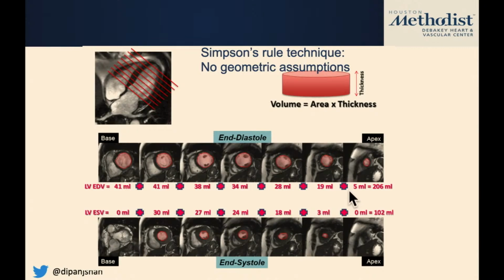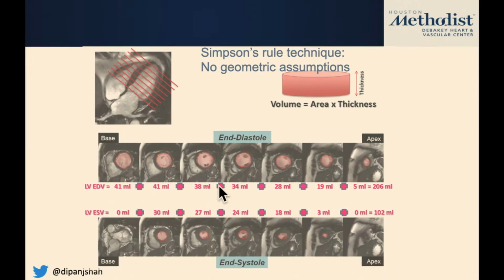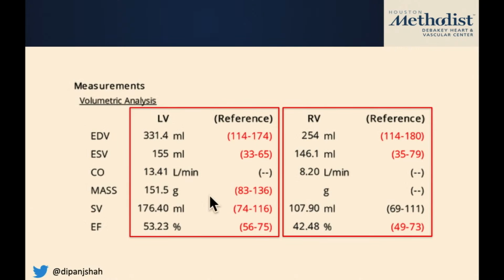But in addition to that, usually what we like to use with CMR is actually to look at global volumes, to look at global end diastolic and global end systolic volumes. And then for this patient of ours, when we couple all of this together, we saw that this person had a problem with coaptation near the A3-P3 interface. We saw that they had severe mitral regurgitation with almost 83 cc's of mitral regurg.